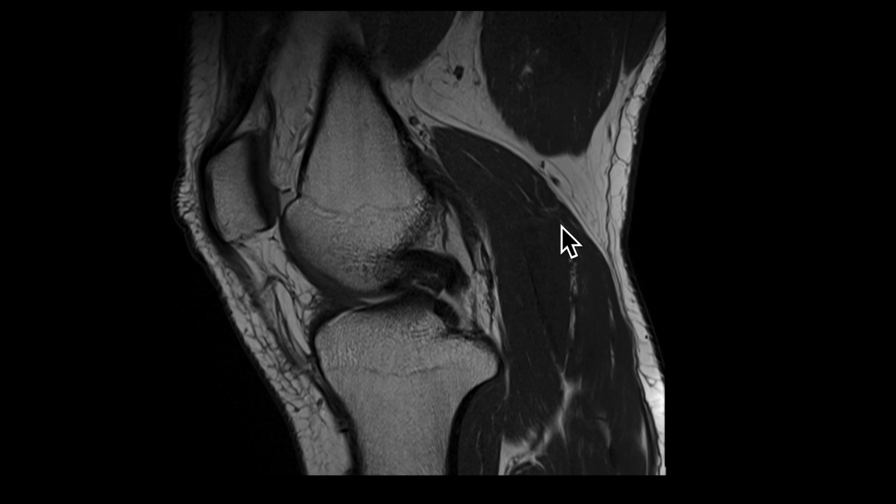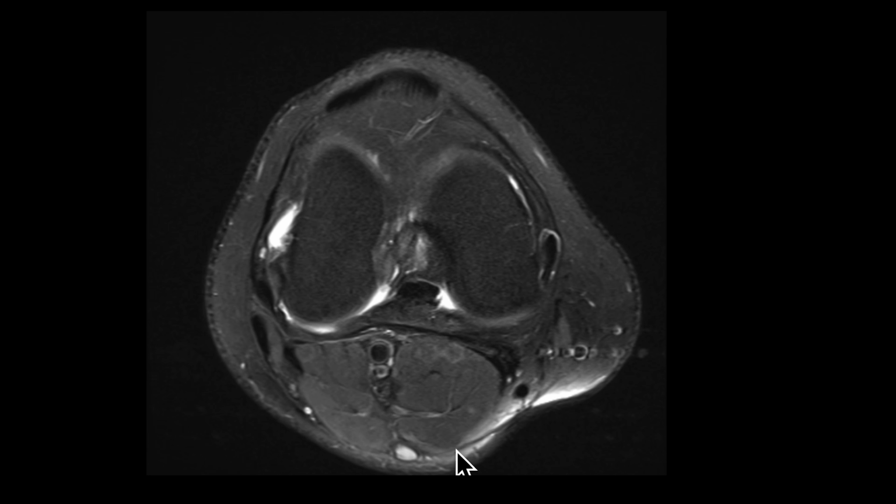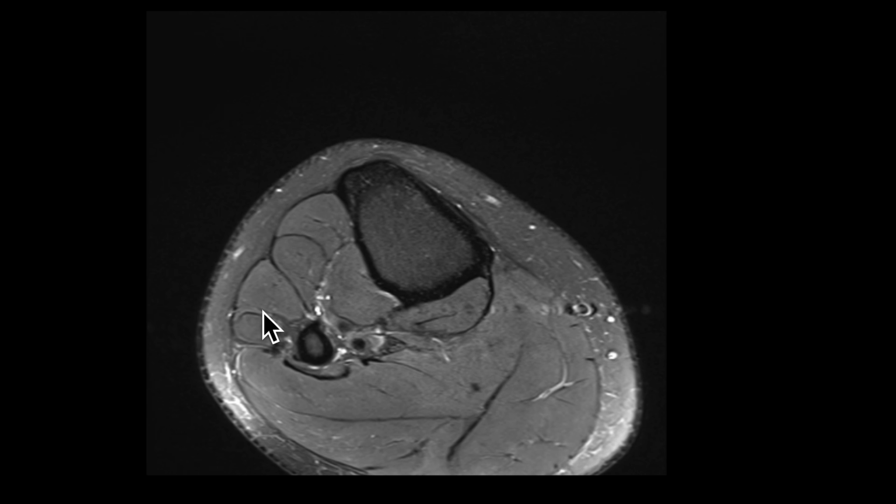These bright areas here are striated areas of fat, which you can see in most patients. But if you have excessive fat within the muscle or the muscle has reduced in volume, then you would consider that pathology. And remember, you can see muscles in the distal aspect of the thigh, but you can also see the calf muscles here. We have the gastrocnemius, popliteus, and anterolateral compartment muscles, as we'd mentioned before.